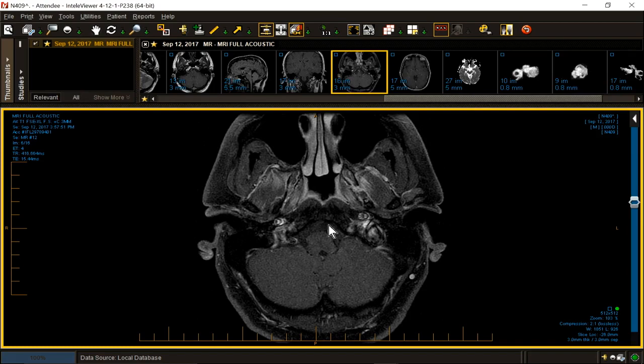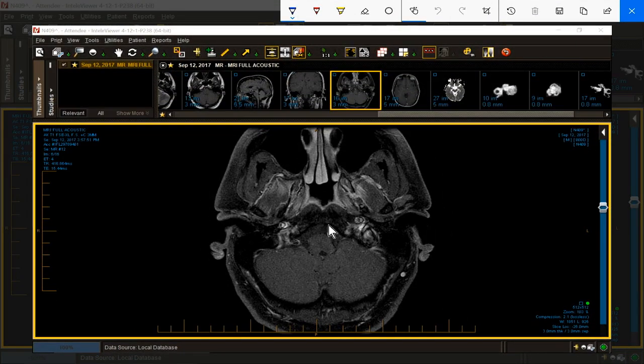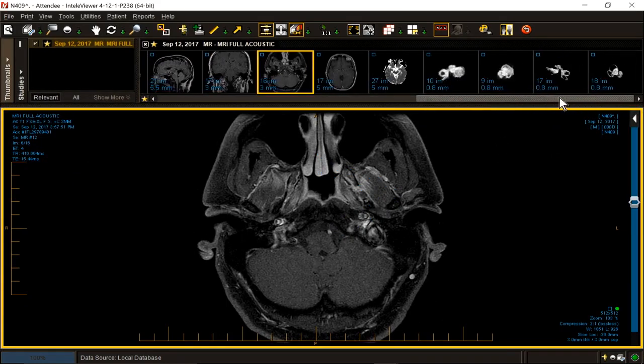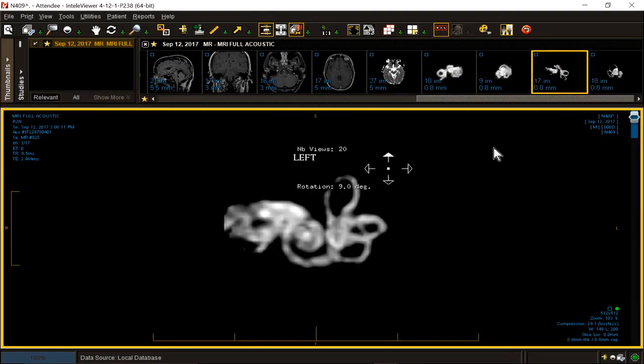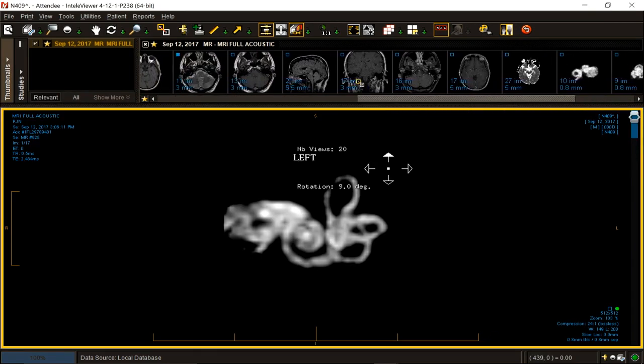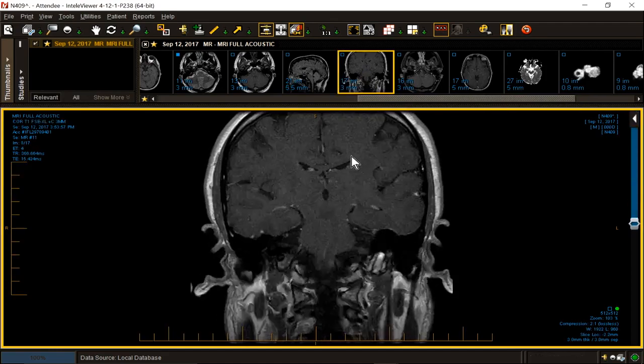Now, if we have an anomalous carotid, these diagnoses are much easier to make on CT. The carotid will swing out laterally like this, especially on the coronal rotatory view of an MRA. See if we have an MRA. We don't. Got a very pretty view of the membranous labyrinth, which looks normal. Let's look at our coronal.